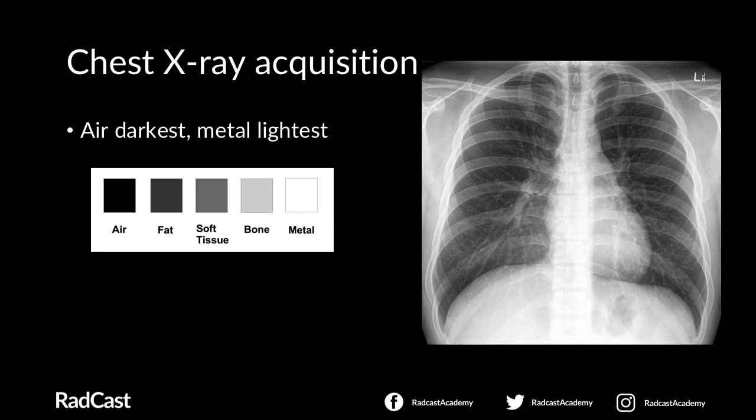If we also look at where the heart sits in this x-ray and the overlying ribs here, the reason that we can visualize the ribs is purely because of the difference in density between the heart tissue and bone tissue. Hence, bone is appearing slightly brighter due to its higher density than the heart, the myocardial tissue underneath, and even the blood within that's pumping through the chambers.